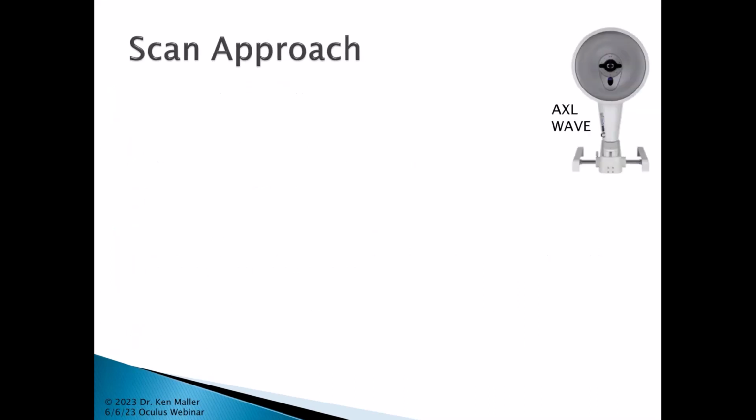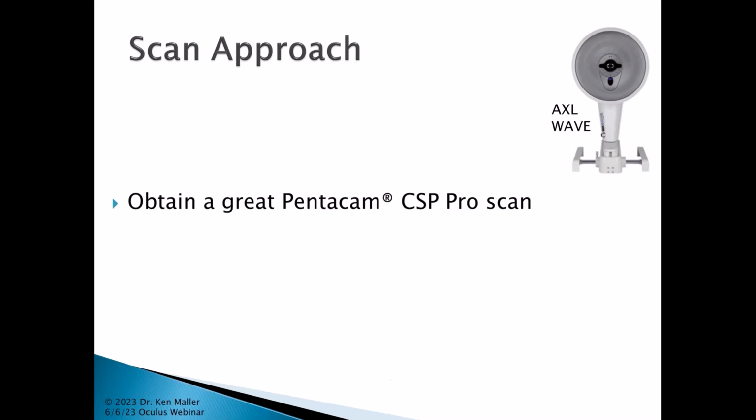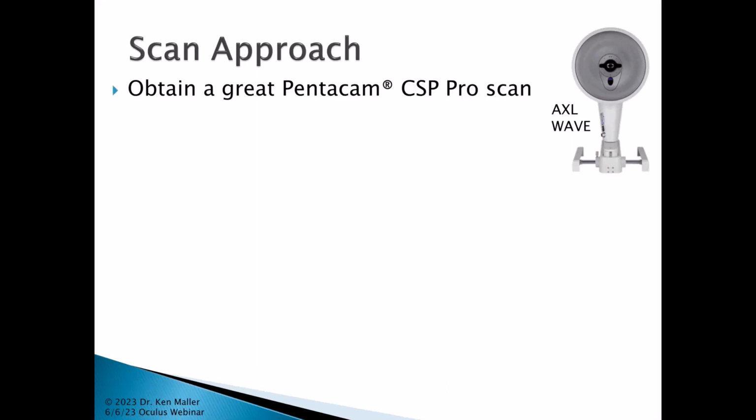So we're going to be talking about the AXL WAVE, and I thought we really need to start off with the basic fundamentals. So obviously, you want to go ahead and get yourself a great Pentacam CSP PRO scan, and once you have that, you really have some wonderful data to design up a lens from. And how would you go about doing this? Well, these are the basics.